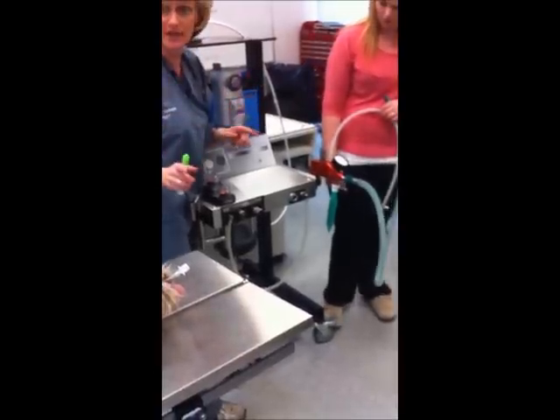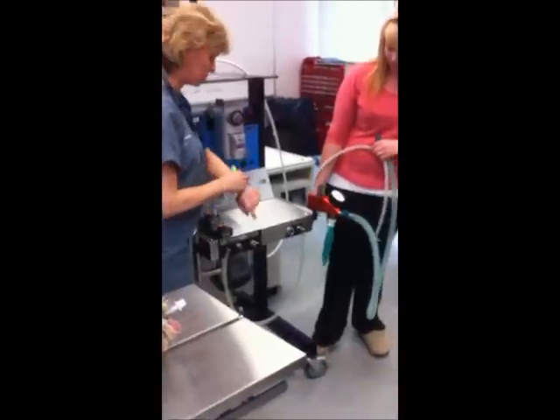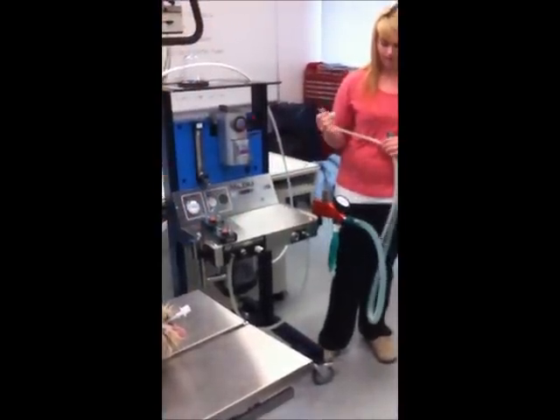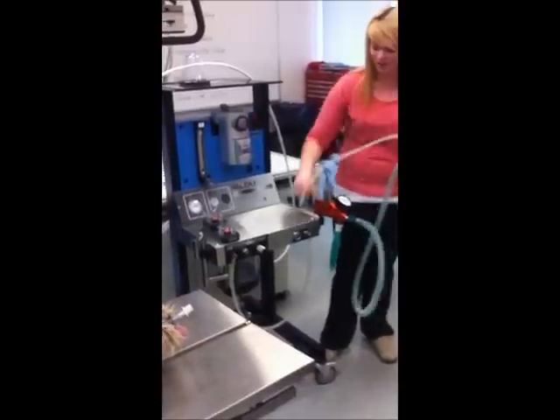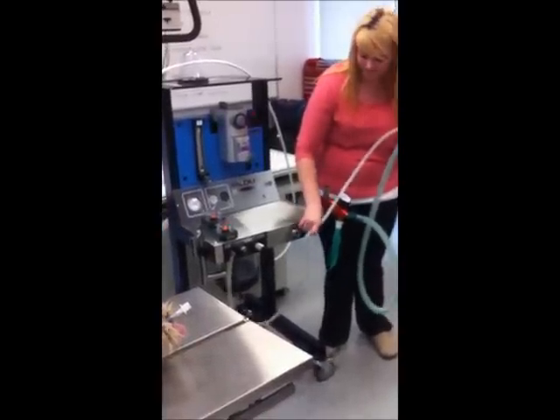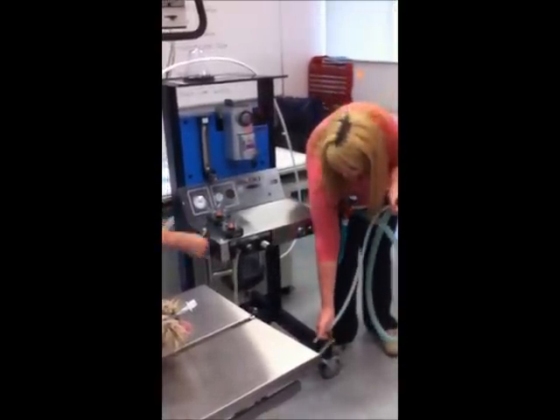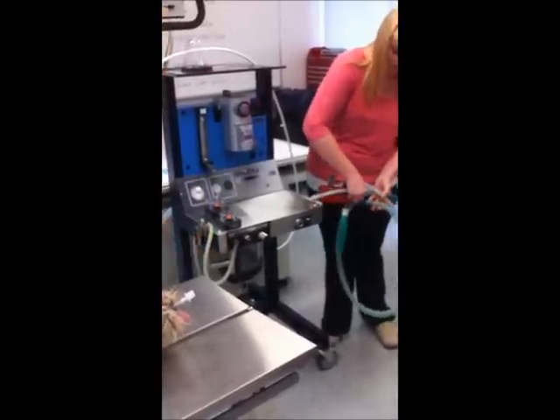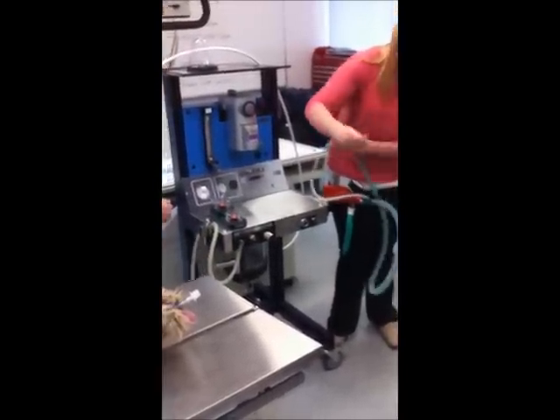So Nikki's actually getting some practice here, and that's good because she won't have trouble in her practical next week. And I would ask you to do the same thing, come and set this up once we're finished going through this. Okay. So what are we going to do to fix what's happening? Take that one off. Put the 2 on top of the green thing. And then put that one in that hole. That one there.